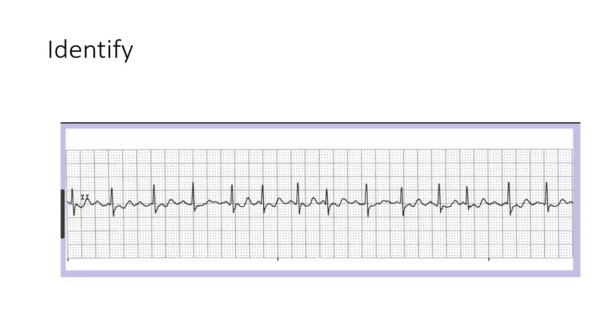Joe, this is a good one. I'm thinking like a flutter off the bat, but can you see identifiable P waves though? Yeah, that's what we're thinking. So if you can see identifiable P waves in your rhythm, that eliminates a fib or a flutter. Because to me, it kind of looks like a 2-to-1 ratio, because the T wave looks inverted to me.